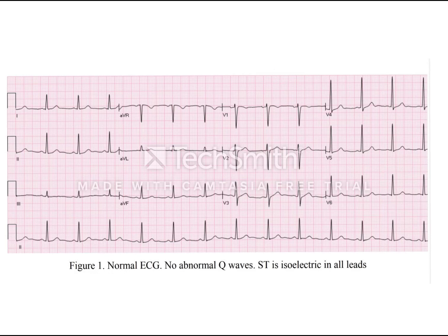If you were to look at V1 and see late-sided forces, here being the QRS, and see the late positive forces in the R versus in V6, where you would see late negative forces here, the late positive forces in V1 and late negative forces in V6 suggest a right bundle branch block because the energy is going rightward, and hence why it's positive in V1 and negative in V6.